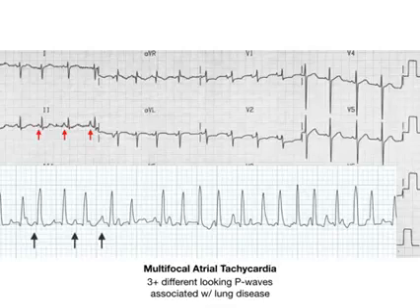Now this is classically associated with lung disease, so something like COPD, where you have elevated pulmonary pressures which cause the atria of the heart to contract irregularly. And all the atria technically have foci that can generate electricity and cause impulses through the heart. Now, normally the sinoatrial node handles this, but in lung disease, there are different areas of electric activity that are incorrectly generating electrical impulses. So you see different P waves because there's the sinoatrial P wave, but there's also the irregular P wave, or the abnormal P wave, if you will, that's generating impulses due to lung disease causing pulmonary backup into the heart.